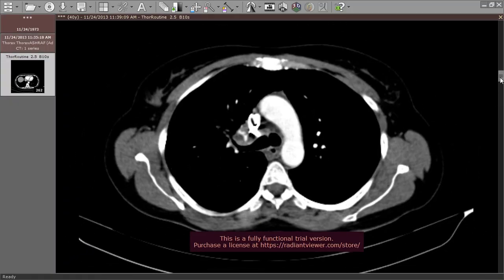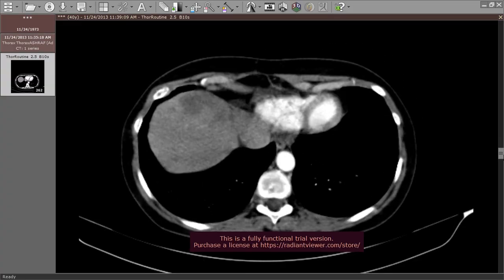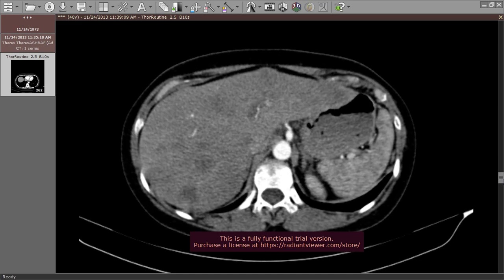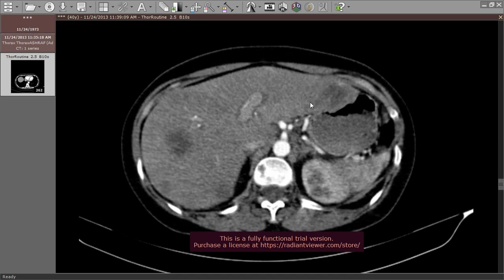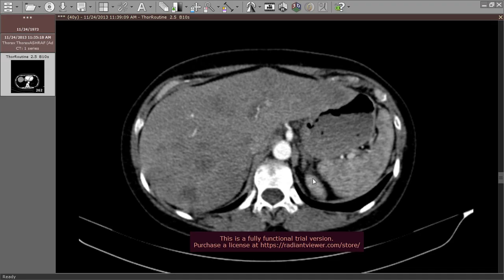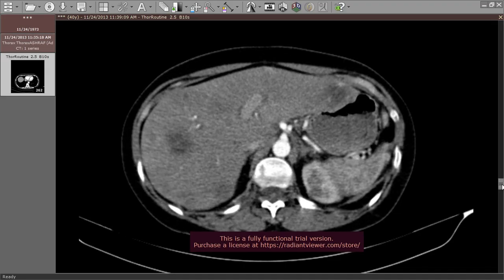Lastly, you have to search for metastatic lesions. Simple in this case, we have multiple focal lesions studding both hepatic lobes. They are liver deposits. What about the adrenal gland? This adrenal gland looks well. The other one.